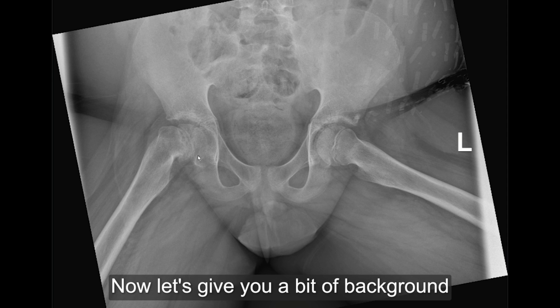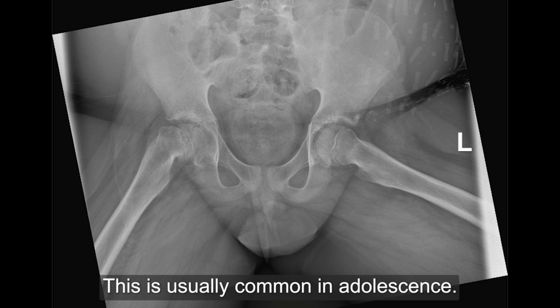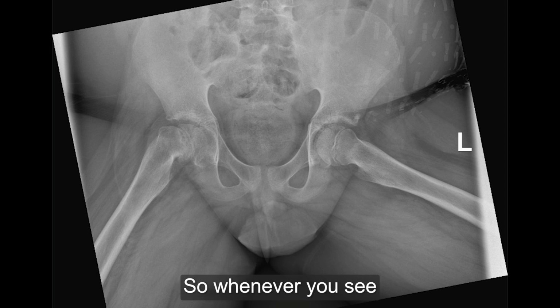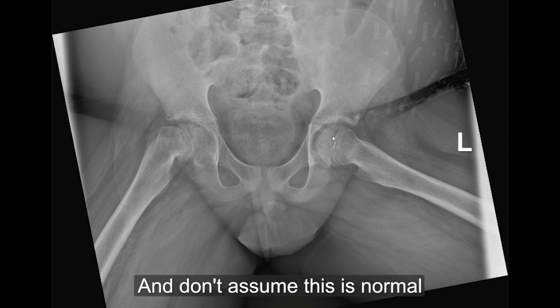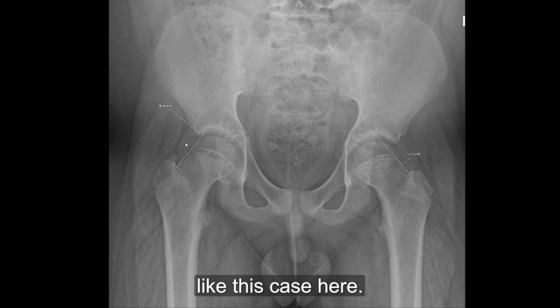Now let's give you a bit of background on slipped femoral epiphysis. This is usually common in adolescents, and it can be seen bilaterally in 20%. So whenever you see one on the right hand side, you should really check the left hand side and make sure you don't miss it, and don't assume this is normal until you do the lines. Make sure you draw the lines, otherwise you will miss subtle slipped femoral epiphysis like this case here.